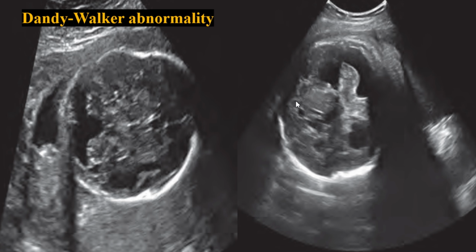And here we can see the Dandy-Walker abnormality, which is associated with the agenesis of the corpus callosum, and this one is the oblique image of the fetal head. Here we can see the choroid plexus, here we can see the lateral ventricles, and here we can see the cystic dilatation of the fourth ventricle in the posterior fossa, and the fluid collection can be seen here, and the agenesis of the cerebellar vermis resulting in splaying of the cerebellar hemispheres is consistent with the Dandy-Walker abnormality.